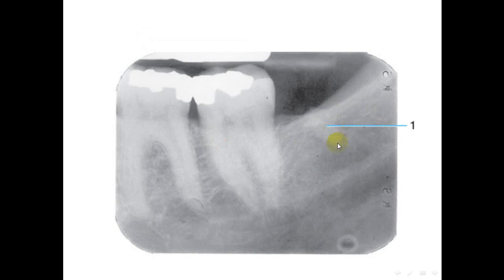This is a retained root, which is the main root after extraction of the lower eight.